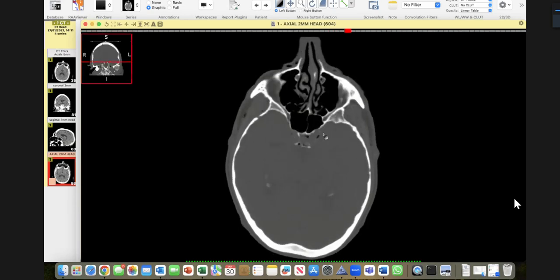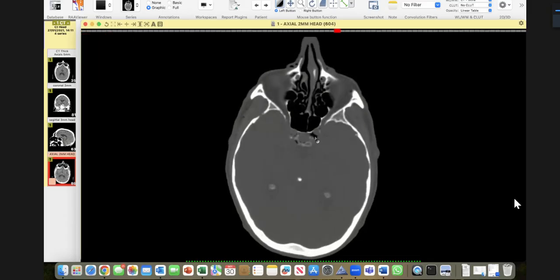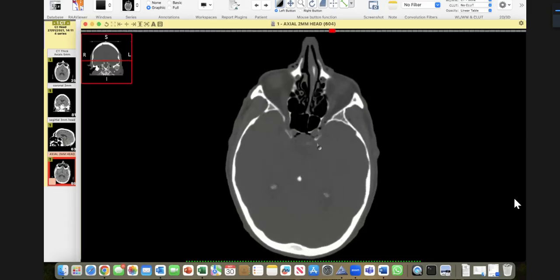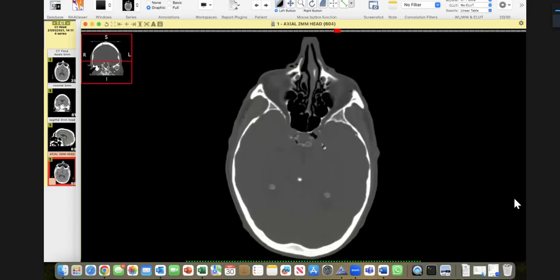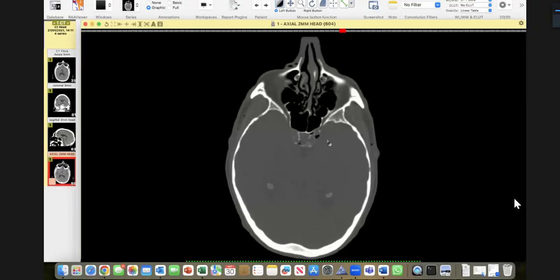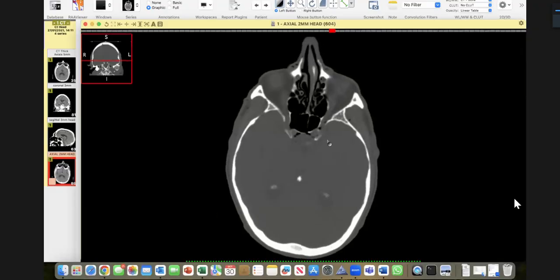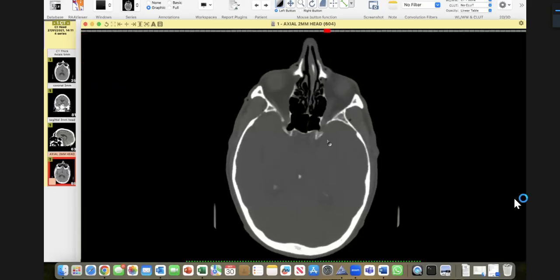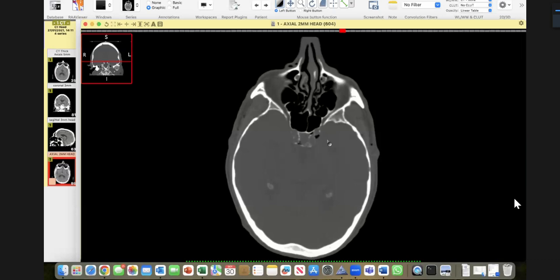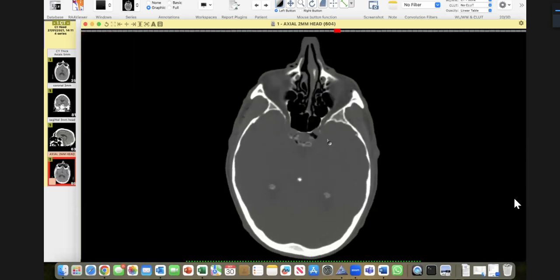So what's happening? I'll take over here, just one second. I think you have pointed out this air. So where is this air anatomically? Yes, sir, over here. So what do you mean? I am asking you anatomically, where is this air? Sir, this is within the cavernous sinus, and it is also seen to track along the left optic nerve in the region of the left cavernous sinus. Right. So how can you explain that?